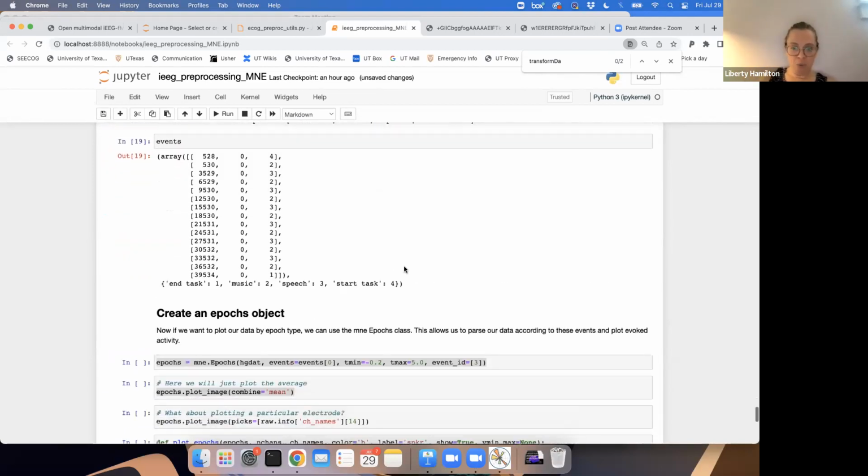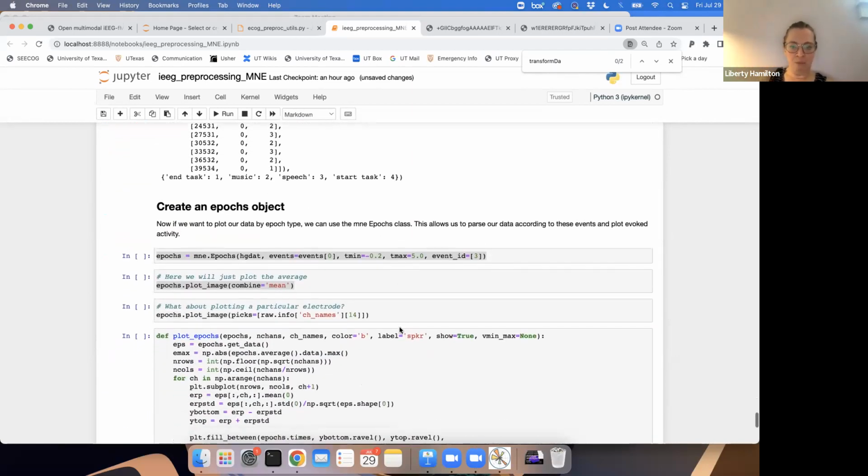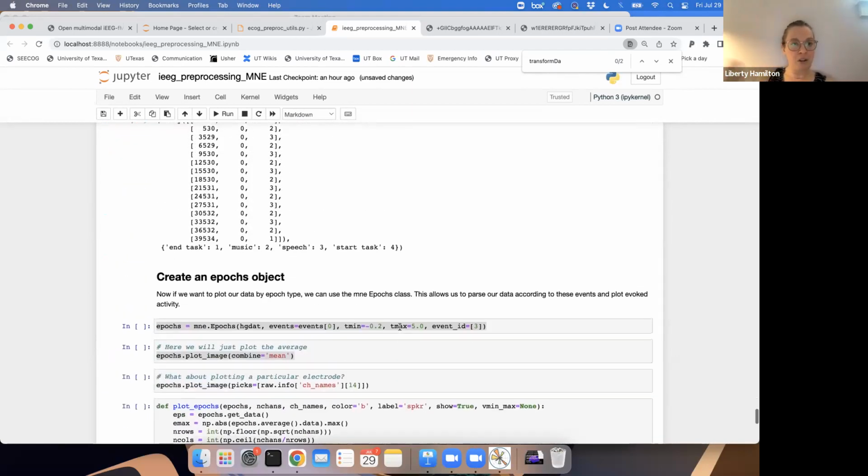And basically, if you want to go through the rest of this, you can plot the evoked data and move through this, and it will show you how these look on each channel. For IEEG, I'd always look at it on the single channel level rather than averages, because you are going to expect that your individual channels are going to have different receptive fields, different sensory coding properties. And so in this case, averaging is not going to help you as much as you might think.